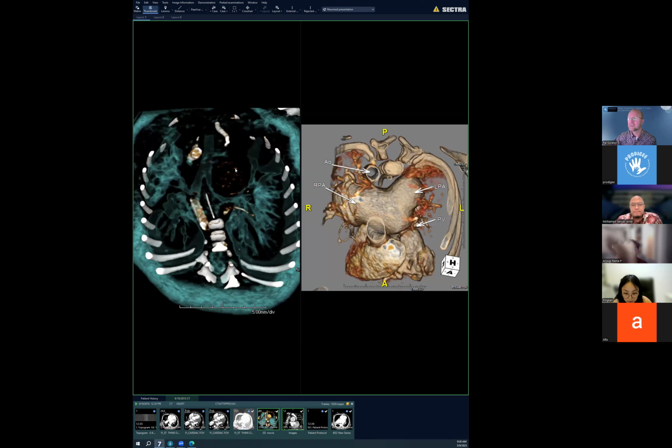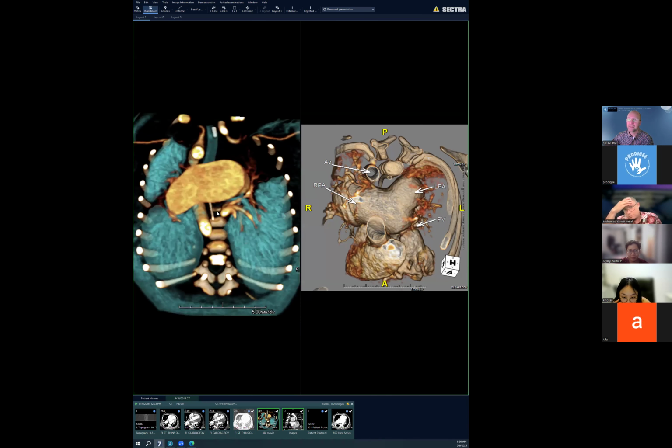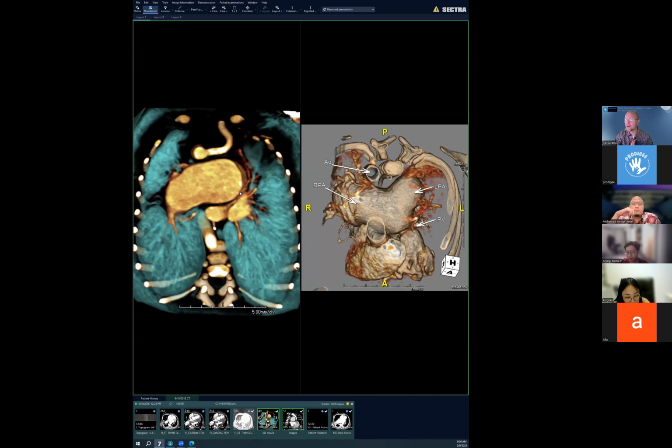Now, some of these patients will have really no visible valve tissue, and others will have some residual redundant dysplastic valve tissue. But if they have mainly regurgitation, then the pulmonary arteries will get enlarged. This is a good reminder for all of us that pulmonary artery enlargement does not only happen from stenosis and post-stenotic dilation, but it happens in a lot of patients from severe regurgitation as well, because the pulmonary arteries don't really know why the flow is increased or is apparently increased.